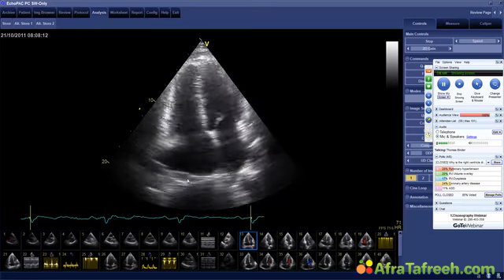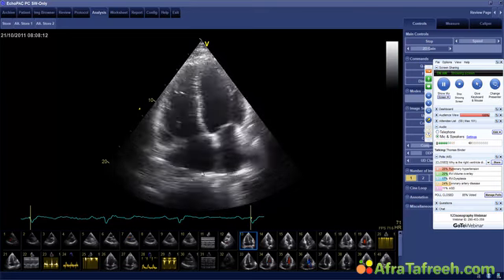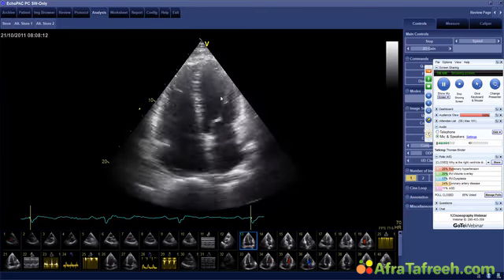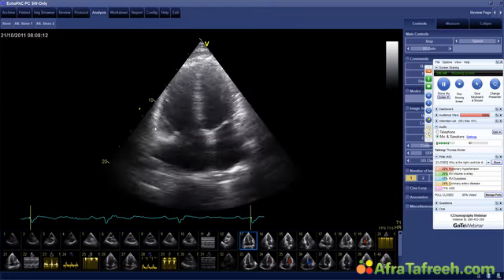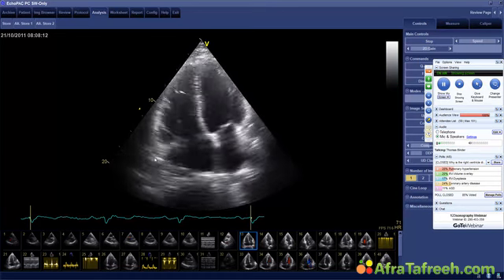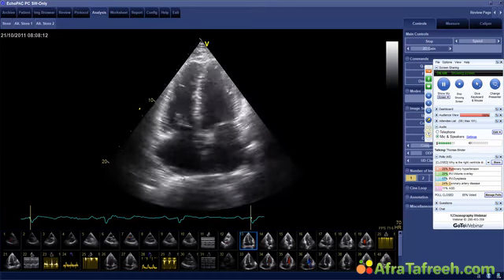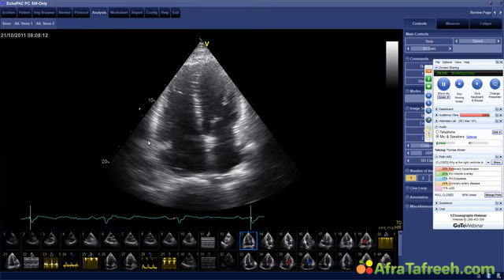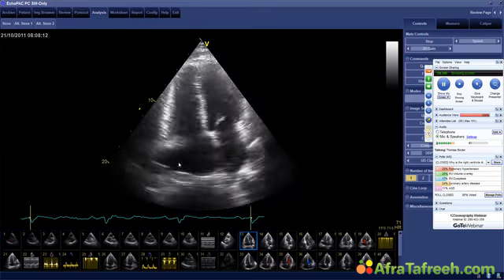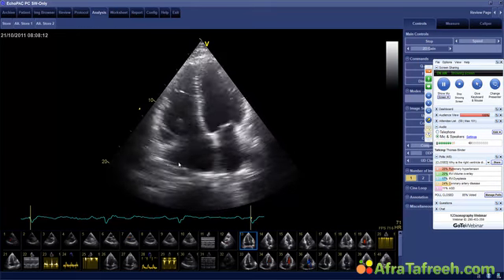Okay, so there is a question that I see that Amjad asked: may it be right ventricular dysplasia as well? Well, yes, this is a differential diagnosis you could have. Why? Because typically right ventricular dysplasia shows you a dilated right ventricle with reduced right ventricular function and usually a very thin right ventricular wall, where you might also have aneurysms in the right ventricle. Now, I do not see aneurysms here, but all other criteria are present. So in theory, it would be a possible differential diagnosis.